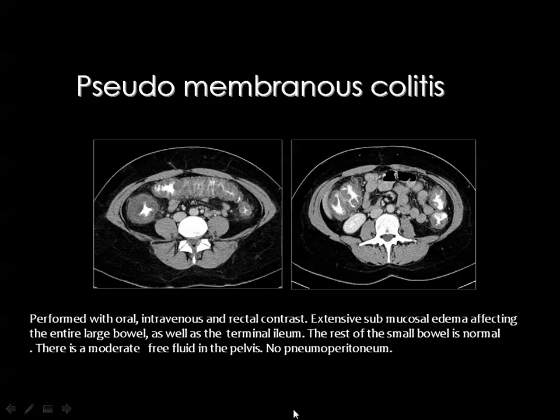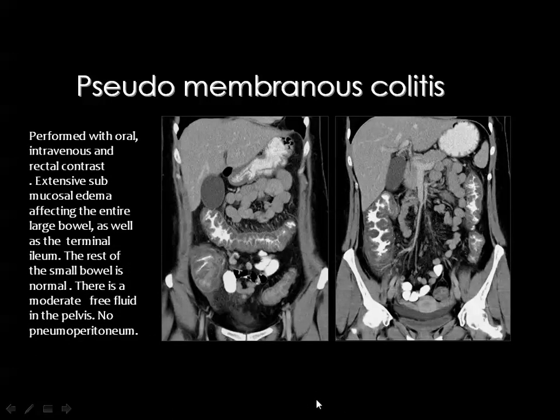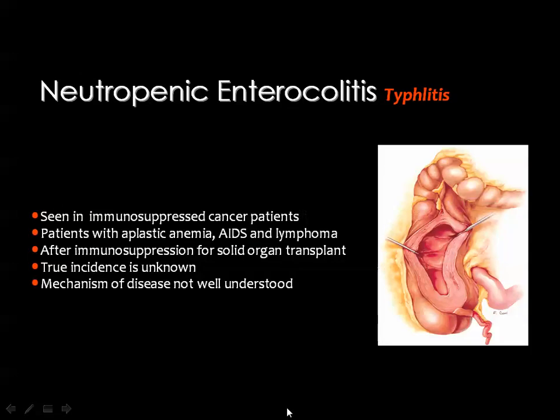This is also a classic appearance of pseudomembranous colitis, showing the previously mentioned data. And if you have multi-detector CT and you reconstruct the images in the coronal planes, it's very helpful to see this typical appearance of pseudomembranous colitis.